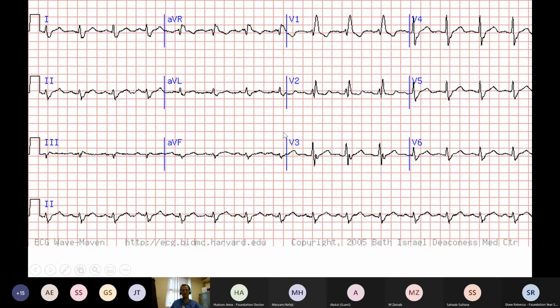So this is bifascicular block, and this again might make me think, do I want to do a 24-hour ECG in somebody who's fit, even if they're fairly asymptomatic, because maybe they'll have a heart block and we could diagnose something before they fall over and break their hip, but it doesn't require pacing. If they had typical cardiac syncope and bifascicular block, that's enough for us to put in a pacemaker without needing to look further.